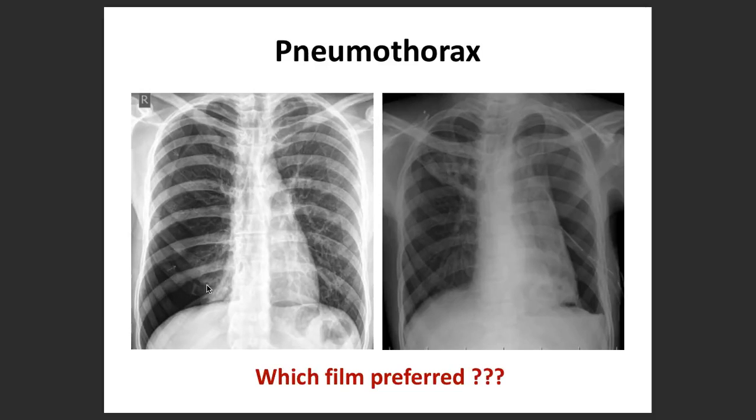Air in the thoracic cavity, sir. Great, great. And what else? So what happens is you should try to look for the outer margin, exactly, the outer margin of the visceral pleura and lung. So what is the pleural line?